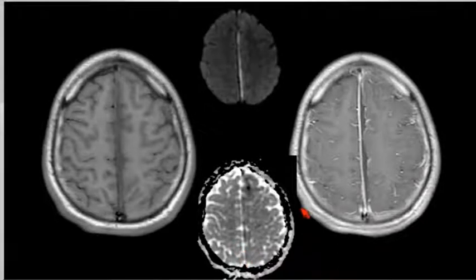So you'll see in other cases, like those H-flu meningitis cases I alluded to earlier, you may have benign reactive subdural effusion. That's not going to be restricted on diffusion. So a key point here is when you have a subdural collection in the setting of infection, that the diffusion sequence is absolutely key in determining whether this is actually pus like this or just a reactive effusion, which would not be restricted.